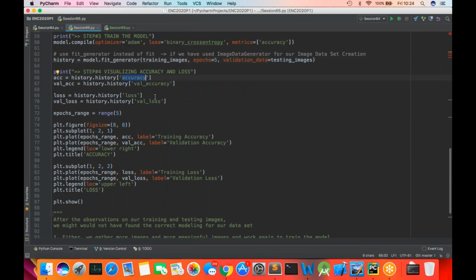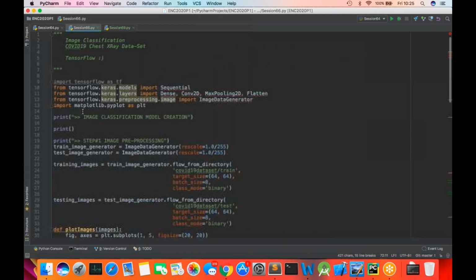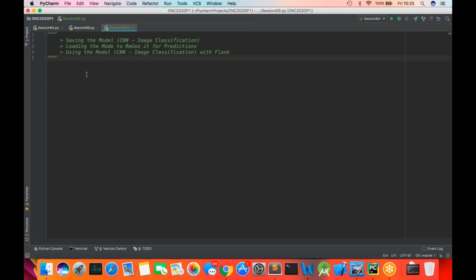So guys, let's try to run the same program. This is session 69. I'm just going to run this same program in session 69.